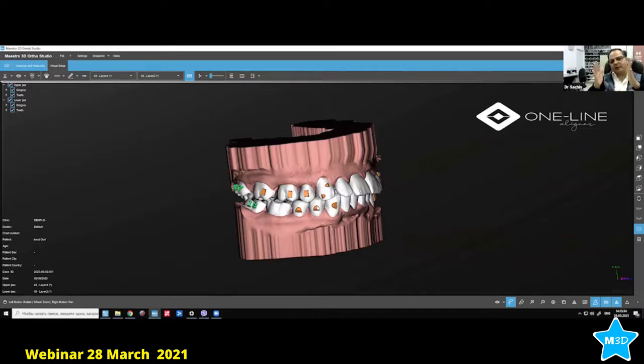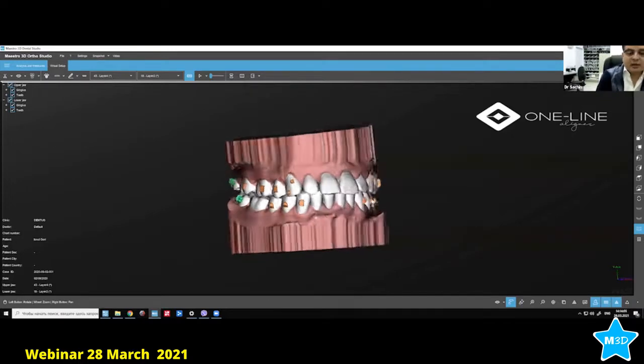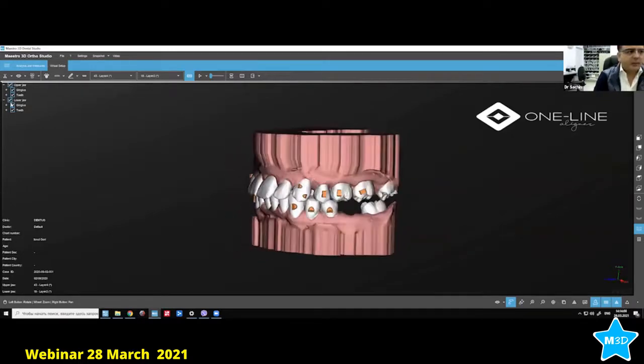Okay, you can always make it bigger, but if you use these ones and you make them bigger, they can give you a little more extrusion on the teeth as well, sometimes if you need it. So you can do the leveling of the curve of Spee by intrusion and extrusion of the posterior teeth with these kind of attachments. If you want to keep them, then the rectangular bevels are better. They just keep it, but they don't have enough surface area to make the extrusion. Okay, it has the effect, but it will not make so much. So if you want leveling with the intrusion and extrusion, then these are better attachments for the extrusion of the posterior teeth when you need that. Okay.